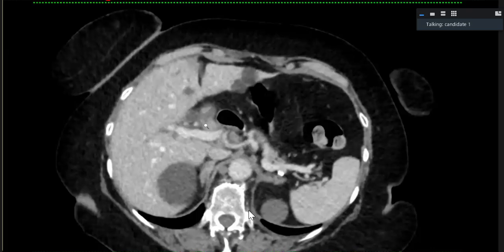This is a soft tissue, malignant, enhancing lesion involving the CBD and the cystic duct, dilating the cystic duct and causing intrahepatic biliary radical dilatation. Maybe cholangiocarcinoma. In my routine practice, this is an urgent finding, as there is an obstructing lesion in the CBD.